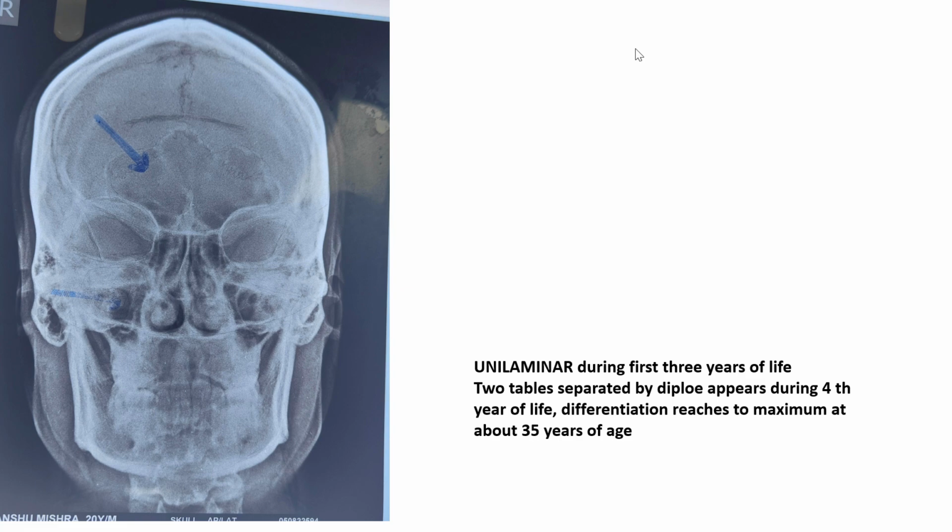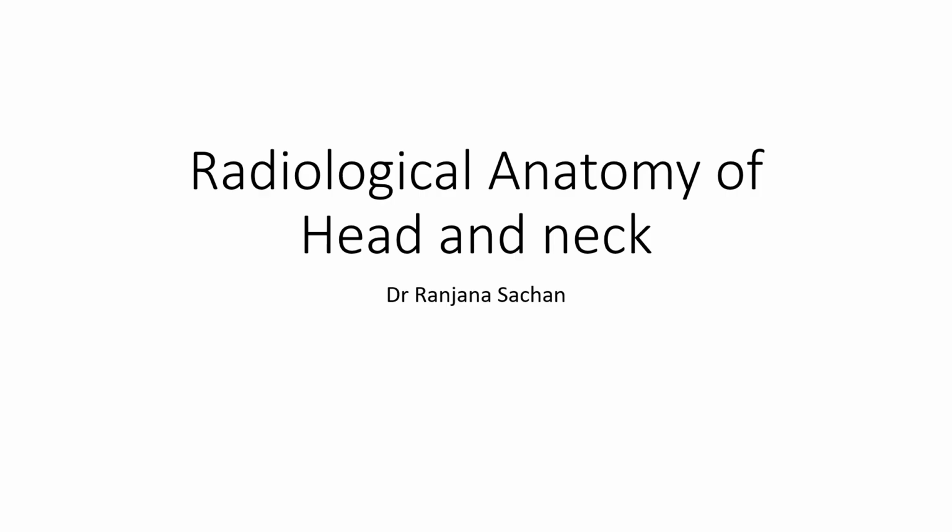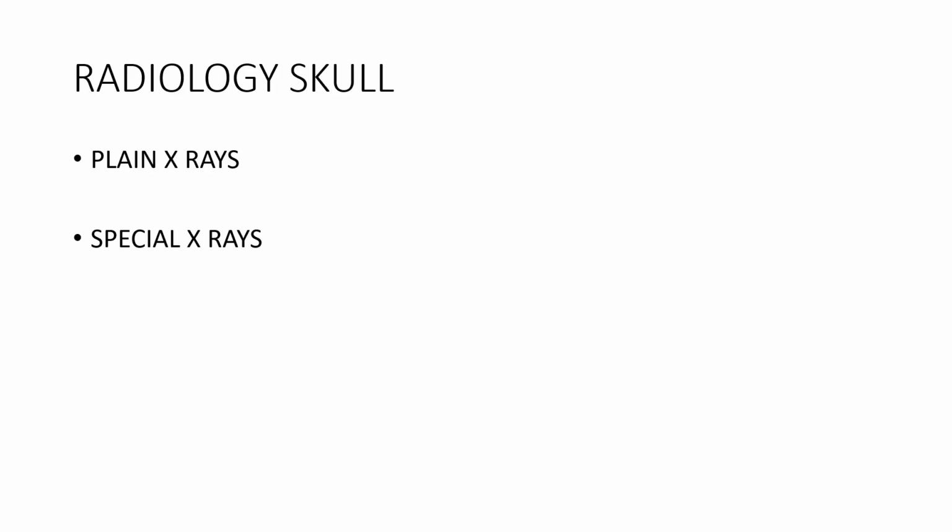So this short video is on radiological anatomy of skull and basically head and neck region. You can see in radiology of skull we take two types of x-rays, the plain x-rays and the special x-rays.